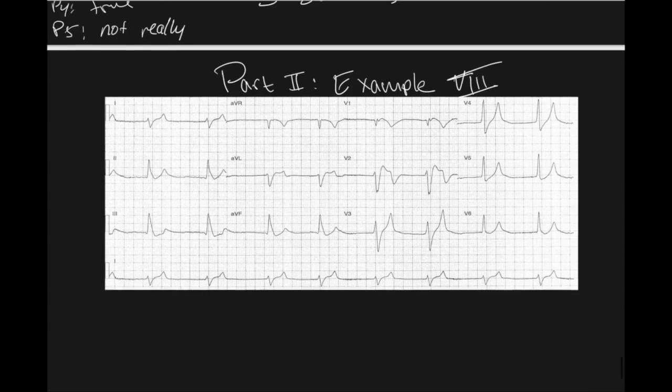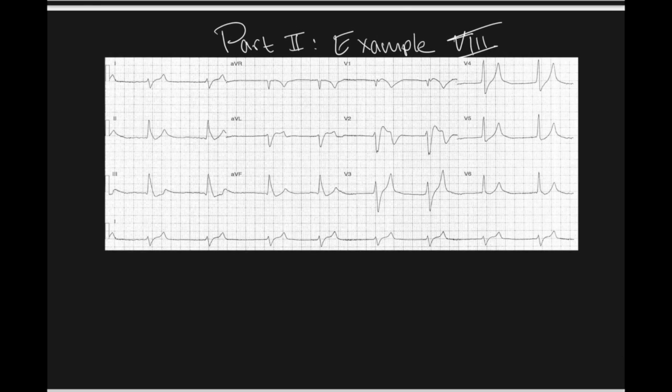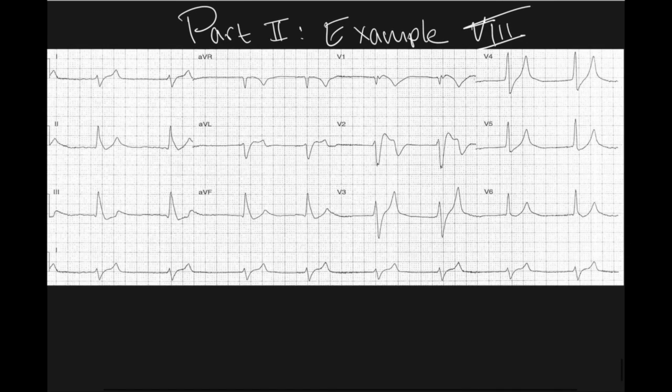All right. Another example, you guys do your thing, the patterns, and then go through each lead, and I'll see you when we get back.